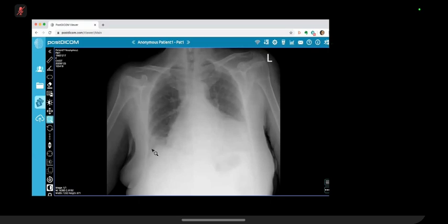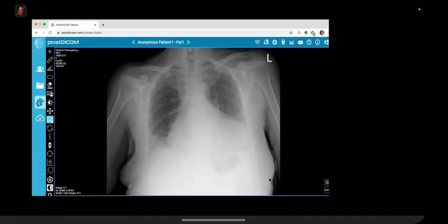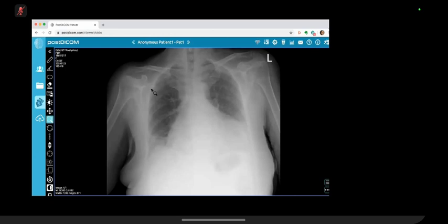Yeah, just a little bit higher than that. It's quite difficult though, isn't it, to be sure if it's a nodule or if it's part of a consolidation. And what about the left side? So that left hemidiaphragm, I think, is mostly here, right? We can just see the hemidiaphragm faintly. Okay. Yeah. But there is something going on within the lung, isn't it? Yes. In the left lower zone.